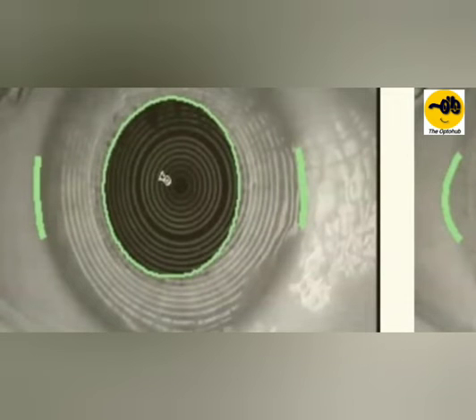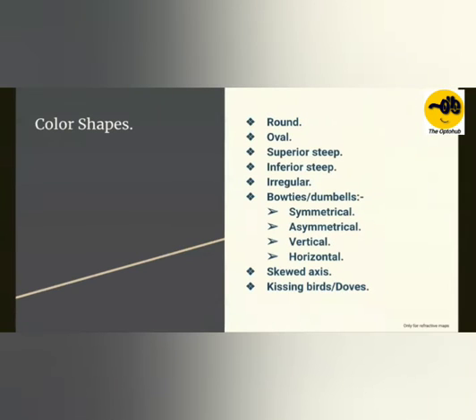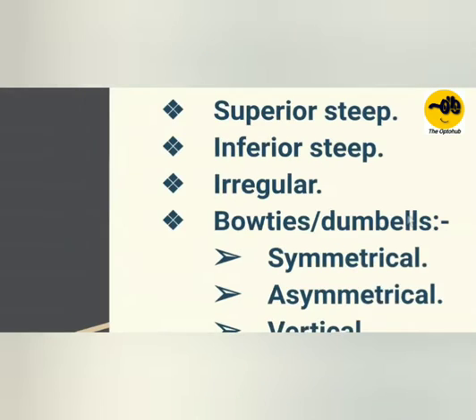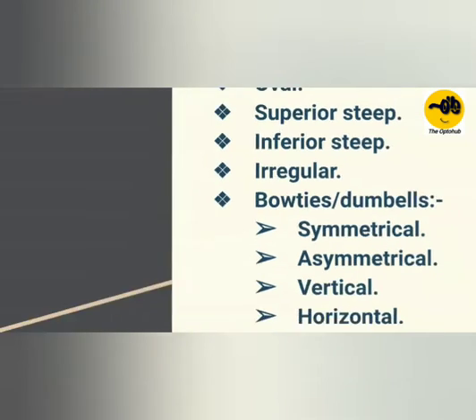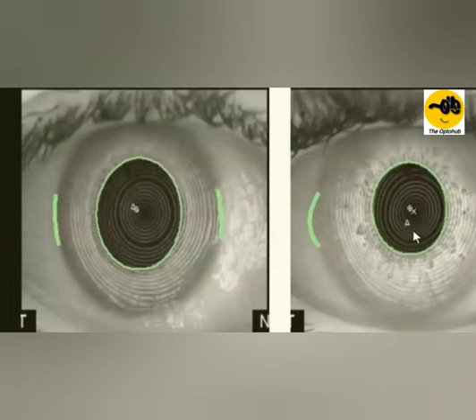Whereas on the other hand, when we see the image on the right, these rings over here are close to each other. I'm really sorry for the screen changing. Over here, you can see the rings are pretty close to each other, especially in this area. On the other hand, these rings are equidistant from each other. They are a very regular pattern.